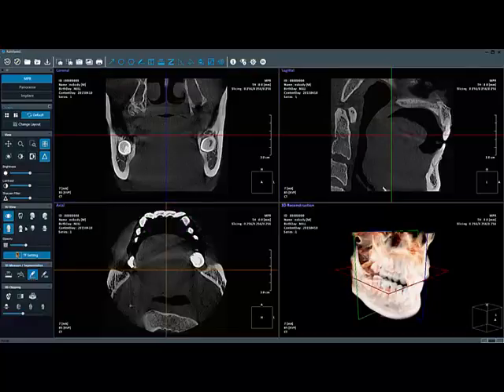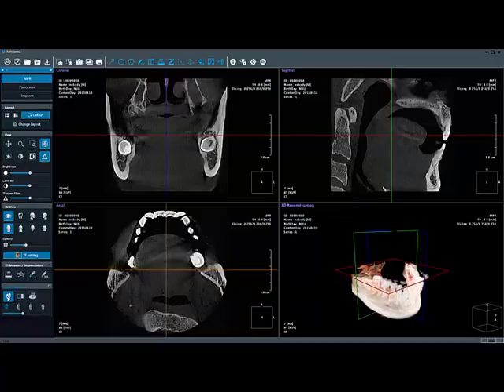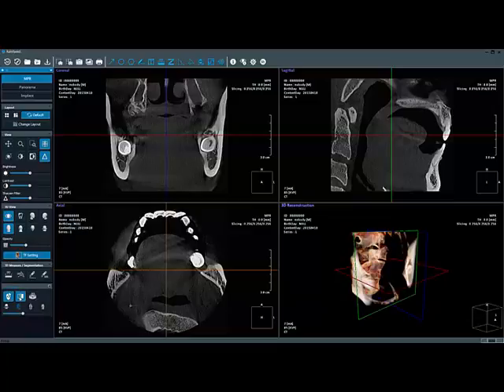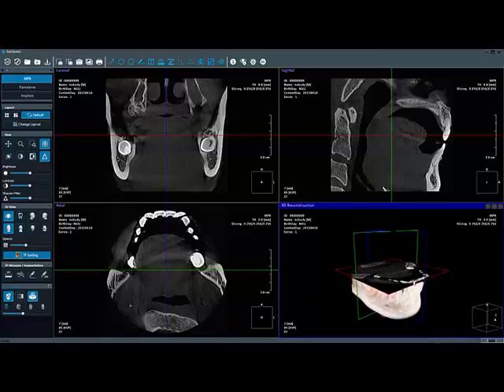Now on 3D clipping, you are able to clip the 3D image based on the selected axis. And the flip clipping inverts the clip based on the relevant axis. You are also able to bring a 2D image to the cutter surface of the 3D image.